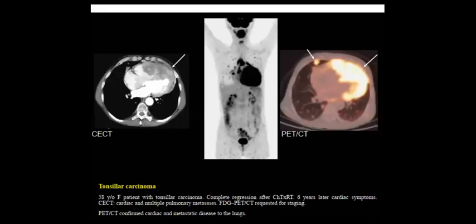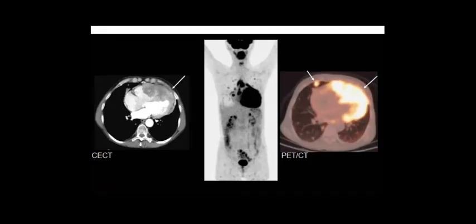So in the PET CT, you don't exclude anything. You put your differentials, you try. I mean, for the regular, maybe you can consider this one: the largest one will be the primary, and the others will be the secondaries. And you will not look in the neck, which is not good. But when you go up and look at the neck and you see this high uptake in the oropharynx, then it could be one of them, especially if you get endoscopy and biopsy from this case.